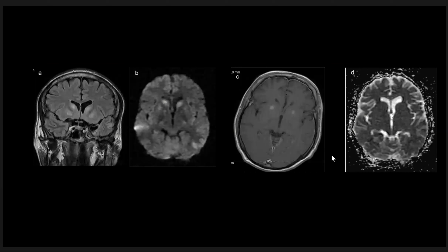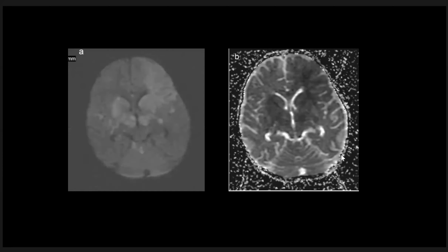In this patient with herpes encephalitis, as we see here, there is typical involvement of the temporal lobe, and also symmetrical caudate and lentiform involvement, with restricted diffusion and some enhancement. Here is a patient with infection due to bacteria involving the basal ganglia, with restricted diffusion on diffusion weighted imaging.